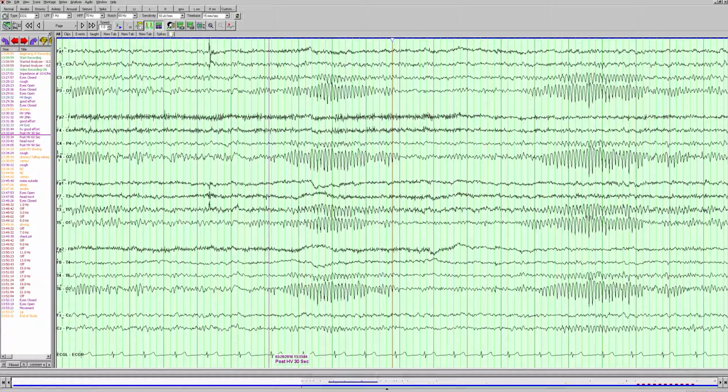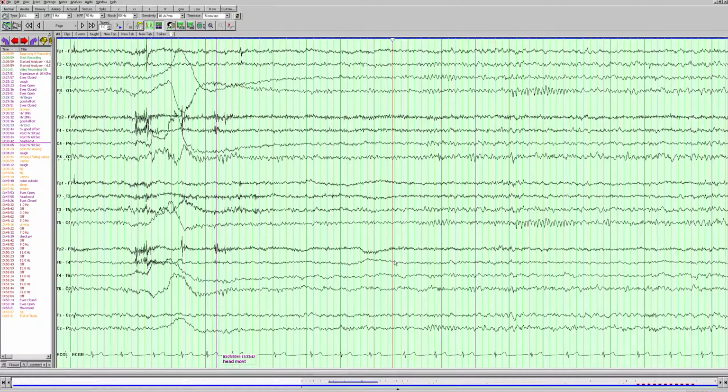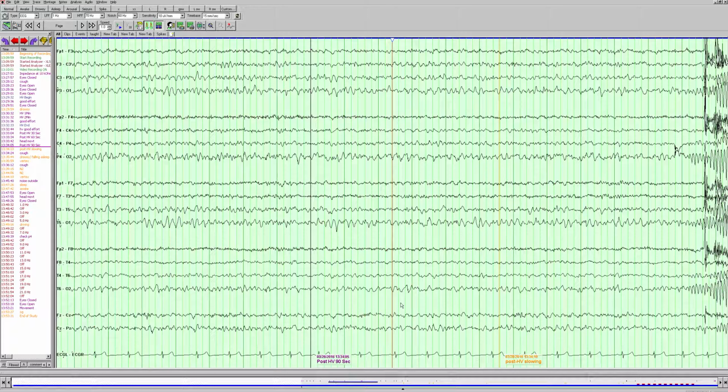The eyes are closed. We see the background attenuating a little bit here, then waking up a little bit. And again, drowsy, and you can just see a change in the EEG here. Even the organization looks different. See how it's just more attenuated? We're not seeing the frequency amplitude gradient as organized as before. So hyperventilation made this patient drowsy. And here again, you can see that loss of that organization with drowsiness.